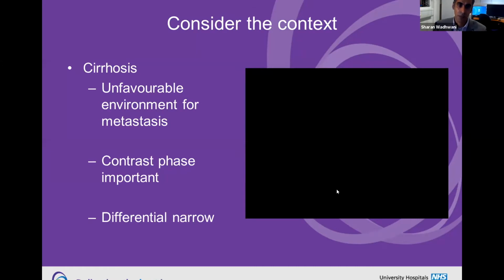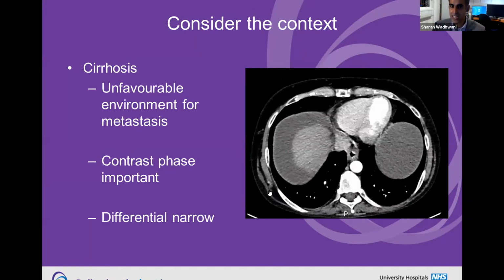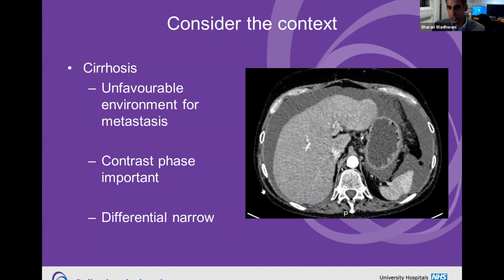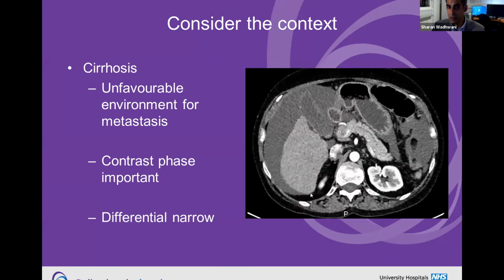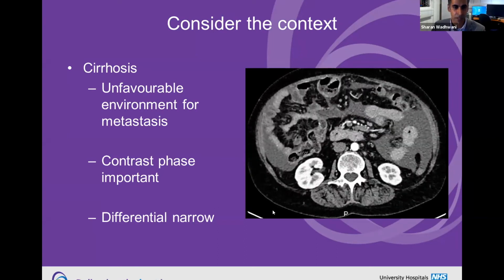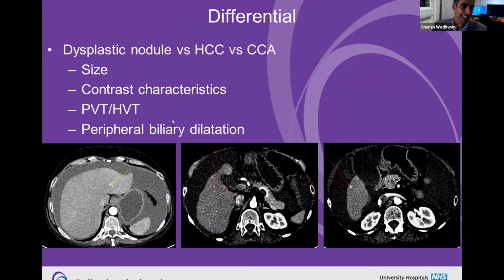Okay, here we have the same patient in the arterial phase, and just keep your eye out. I know this is fast, but look out for some lesions, okay? Lesions that you think might be something. Again, it's difficult. I'm scrolling fast deliberately. One, because we've got to get through a few cases. Two, because we've got a backlog of scans to report. So this is real time for me now.